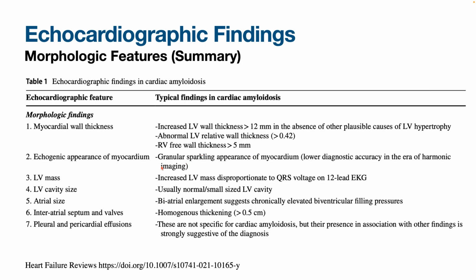The echogenic appearance of myocardium can also be useful, and they often have this starry night pattern, the granular sparkling appearance of myocardium. But because we started using harmonic imaging about 18 or 20 years ago, it makes it less specific. On the other hand, you can actually turn off the harmonic imaging to take pictures of it, and then you can still use it as one of the diagnostic methods.